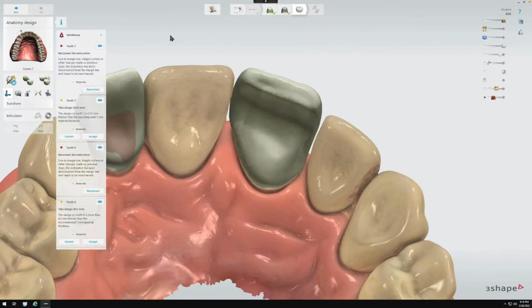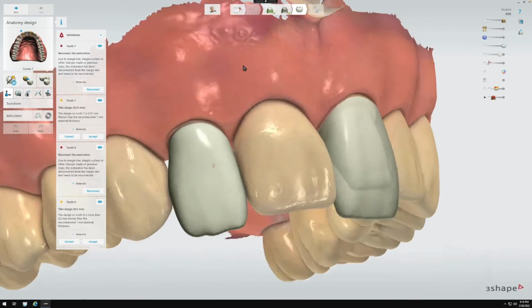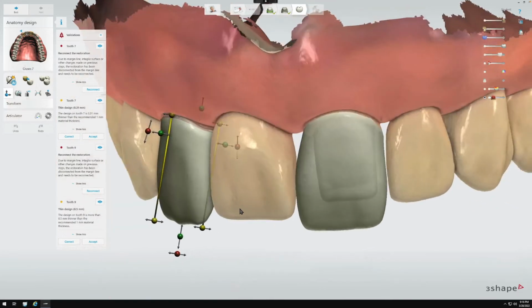All right, so designing is quite nice here. You can see the software automatically created a design for both number 7 and 9. They are pretty terrible. Sometimes the software will do a decent job in designing and give us a pretty decent rough sketch, but sometimes it does something wacky like this. So pretty long in the tooth here.